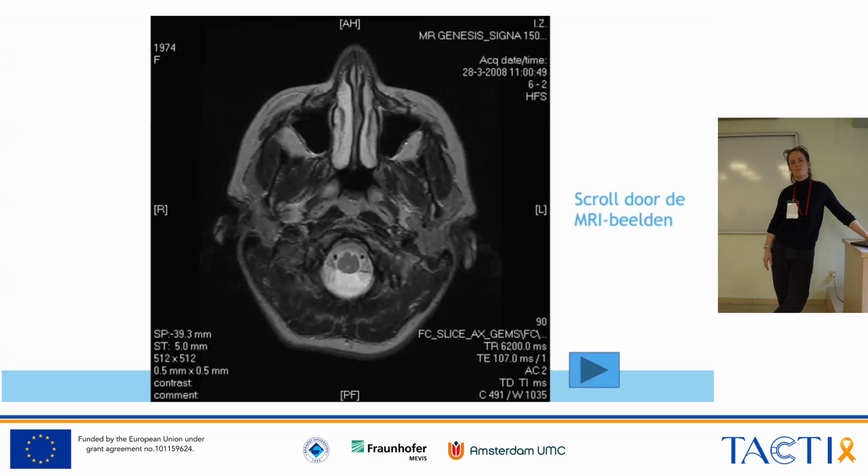Is it that all these lesions happen in weeks, or is it broader? So is this all in the same time frame you meant? Yeah, no, often not. Often you see lesions that are older, and you know they are older because they don't enhance with contrast anymore. So then you know that's proof that they are older than the symptoms, if that is only there for 1 or 2 weeks.